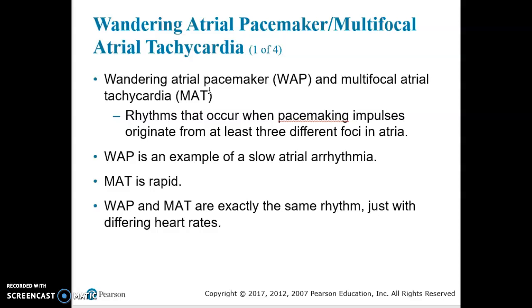These two rhythms are the exact same rhythms. The heart rate is the distinguishing factor of whether you're dealing with WAP, wandering atrial pacemaker, or multifocal atrial tachycardia. A sinus arrhythmia differs from wandering atrial pacemaker because they have uniform P waves, okay? So in a sinus arrhythmia, remember, sinus tells us that it's firing from the SA node. So if we're having that sinus arrhythmia, the P waves are going to look the same. They're going to be uniform because the rhythm is originating in the SA node.